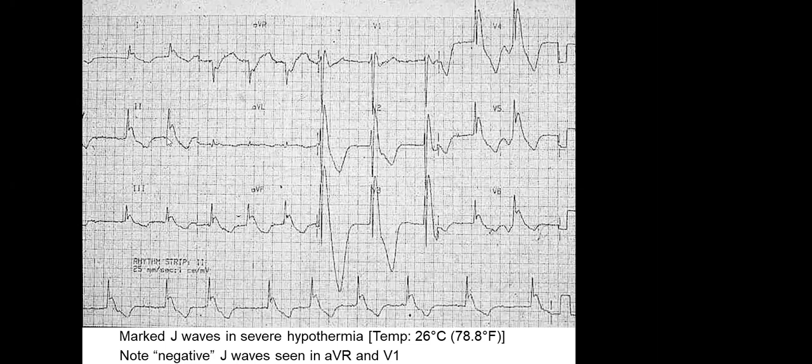When we talk about left ventricular depolarization, R is sharp, then it repolarizes, and because of RBBB there is another right ventricular depolarization which gives us a sharp R wave. Here we do not have a sharp positive deflection, and thus this is the J wave.